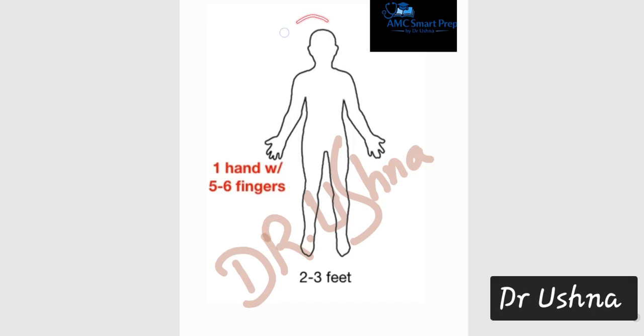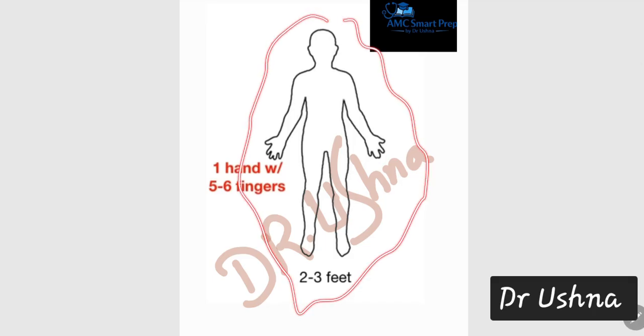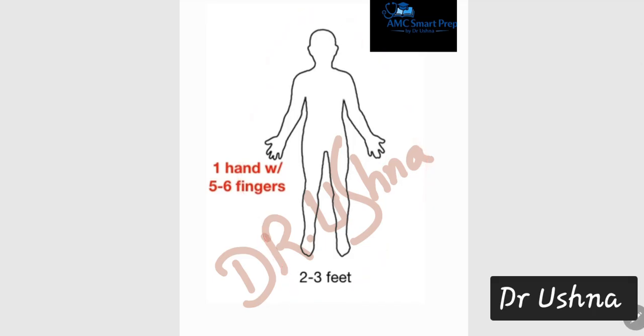Just take the example of this patient, a normal patient for whom you are interpreting the ECG. So remember 2, 3, feet. Feet are at the bottom, inferior. So remember 2, 3 and feet for AVF. This is for your inferior leads. Okay, so this is very easy to remember. 2, 3, AVF, 2, 3, feet. This is your inferior lead territory.